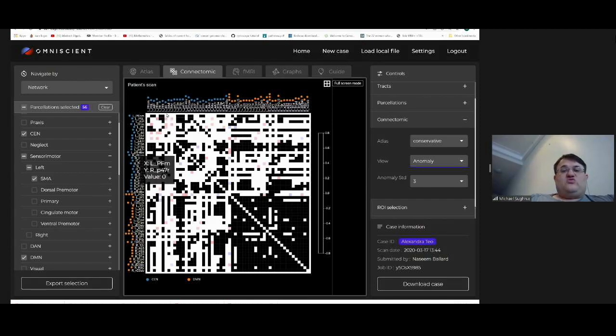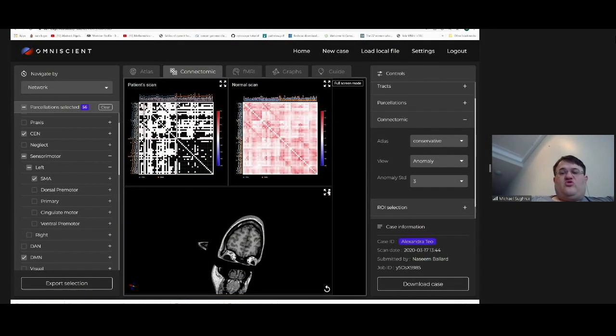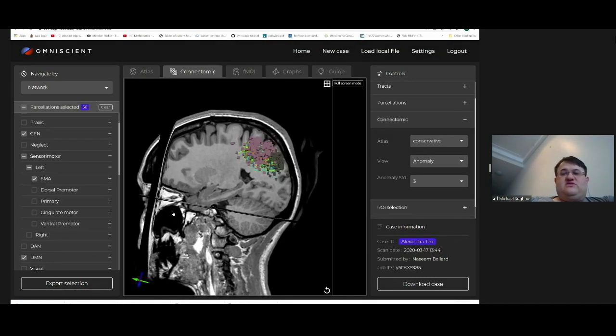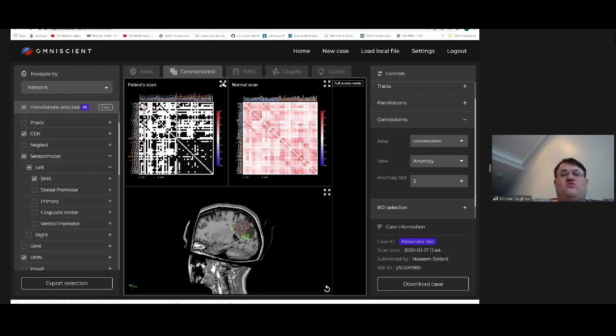less than. And so one of the ways that we've thought to use this, for example, for TMS targeting is, for example, if you notice that there are some of these columns that have lots of anomalies in this. So whether this is the best target is a clinical and research question. But one of the things that is very useful is we can pull that target in 3-dimensional space as an ROI. So see, that's what we just called up right there. And so it's very seamless for interworking with, well, what's abnormal?